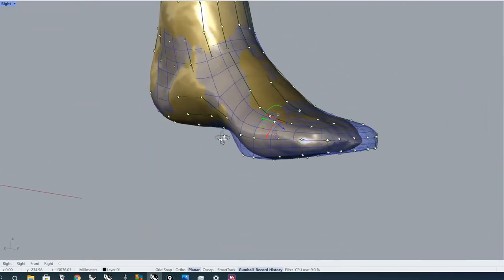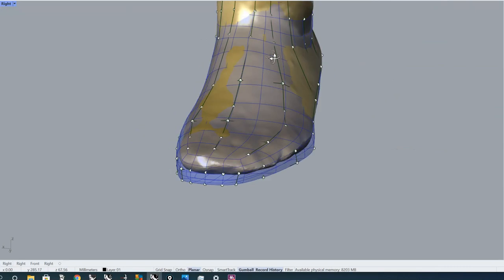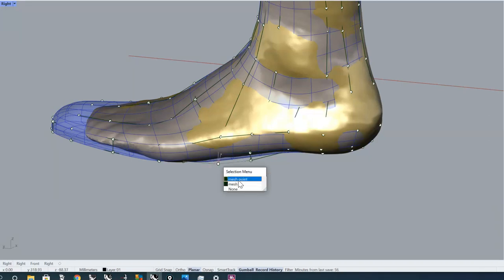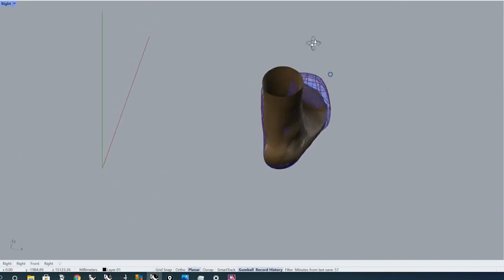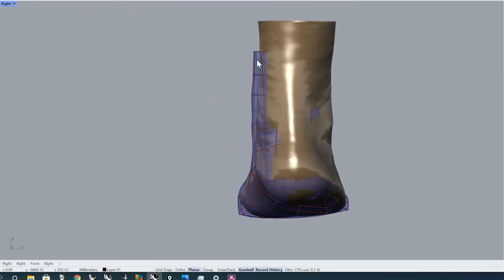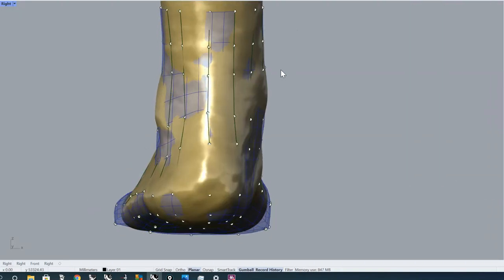Okay, well, that comes a lot closer. Some extra room here on the top is also advisable. Extra space around the ankle, but all those little adjustments I can also do later. What I'm doing first now is check again how I'm on the right side. You see, there are now two big differences between left and right. Here on the left side everything fits quite nicely except the ankle. That has not enough space yet, but I'll do that later.